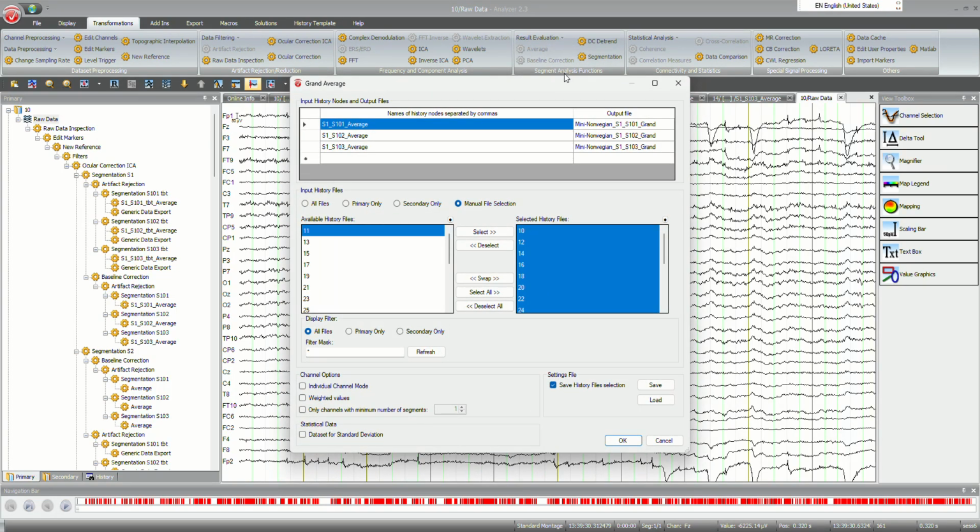All right, and we see here that we have some assignments ready that had been done earlier, and we just now need to create a couple more corresponding to our other grammatical problems.